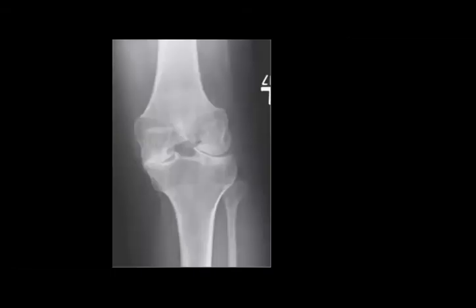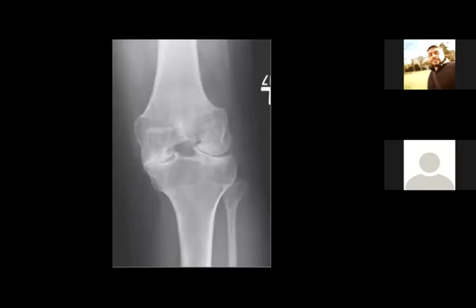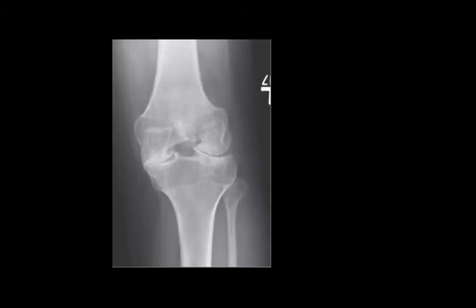So until now, the cases are going smoothly with you. I hope that it will be like this for all of them. So what do you think about this one? How do you describe it? Shayma, nice. How do you describe it? Ahmed? Ala.